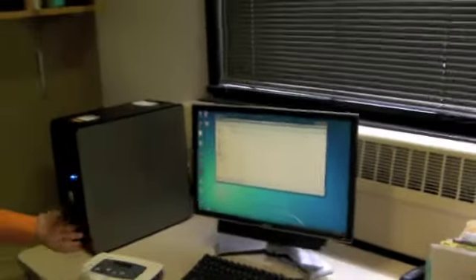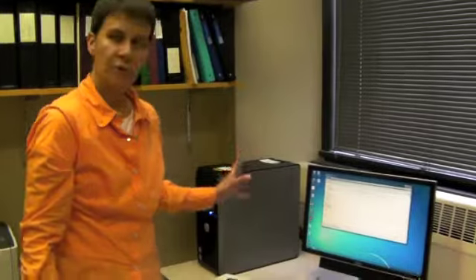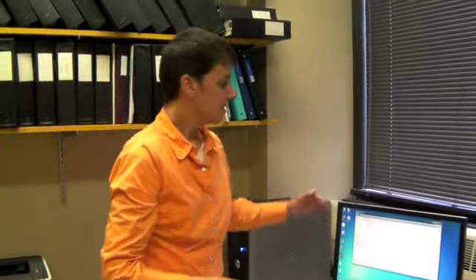And then the next time I download data, it will create a new temporary file. And again, all of the tests that you have previously downloaded, in addition to any new ones since the last time you downloaded, will be shown in that temporary file. And so what I'm going to want you to do for subsequent weeks, after you've done the first time through, is you're going to need to see where the test numbers begin for this new week's data.